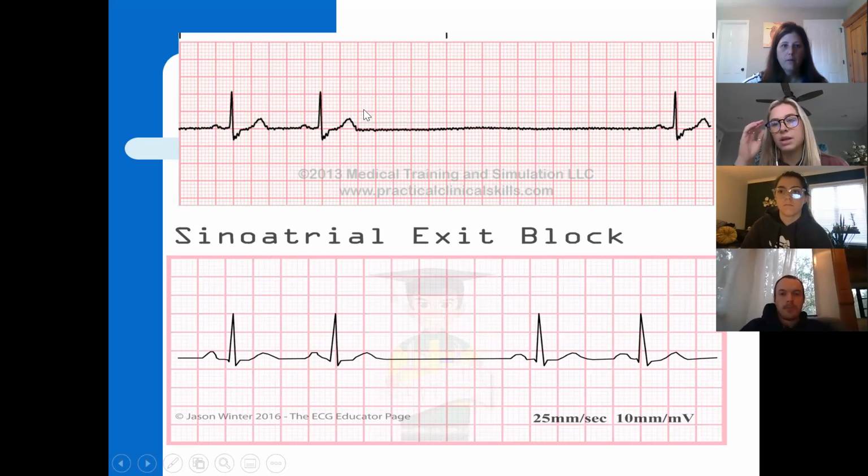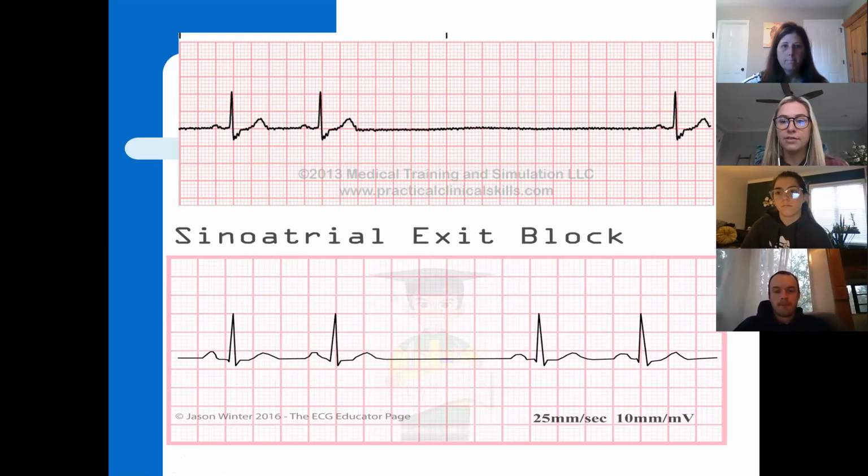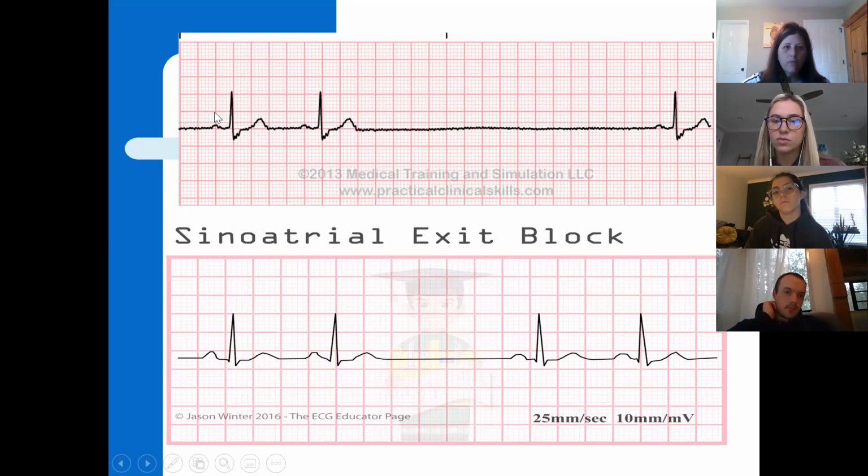So does that mean that would be greater than 5 or greater than 10? So it's greater than 2 previous cycles. If we measured a cycle from the P to the end of the T, and the P to the end of the T, you could count this whole thing out if you wanted to. So that's slightly before that box.